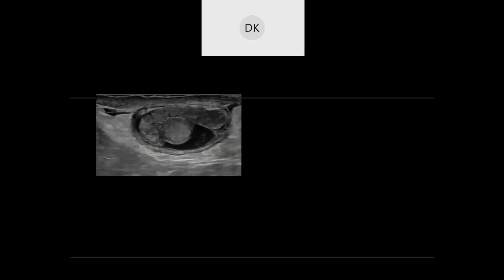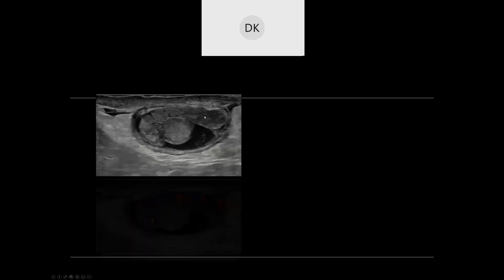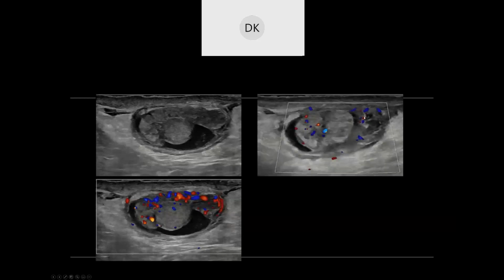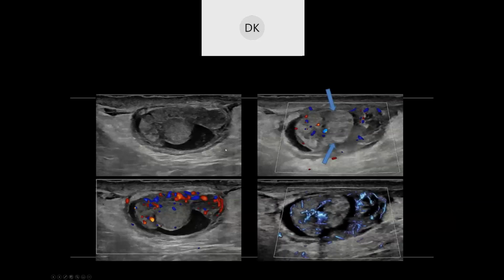So here's a patient. This was an 8-year-old male who came to the ED for continued testicular pain. And notice how the epididymis is heterogeneously hypoechoic and enlarged. When we add color Doppler, it's very hyperemic. There's also a small hydrocele. And then interestingly, there's this area here, this ovoid heterogeneously hyperechoic focus that seems to be avascular. And then when we add microvascular flow imaging, you could see that it's avascular there. We don't see any flow, but we do see hyperemia throughout the epididymis.